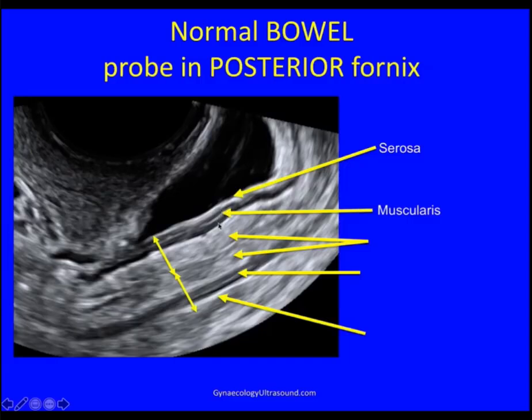This is normal muscularis, and the outer dark is the longitudinal layer. Then the white is a little bit of fibrous tissue, and then the inner circular muscle layer is there. So together, this is the muscularis. You can always find it because of this thin white line. Then this here is the submucosa and mucosa together. And then on the other side, you've got submucosa and mucosa just there.